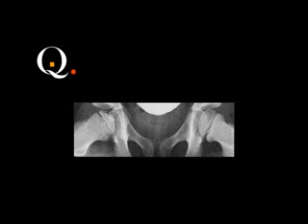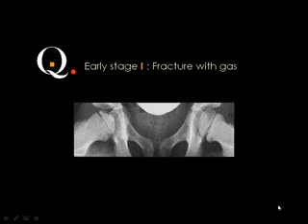Fracture? No. Don't diagnose subchondral fractures in the pediatric age group. Don't do this. And subchondral fractures are usually stress fractures, and they need the epiphysis to be fused in order to occur. This is a fissure due to Perthes disease, stage 1 Perthes disease.